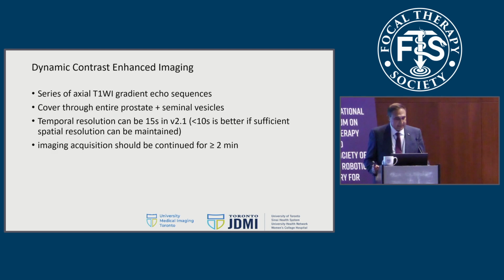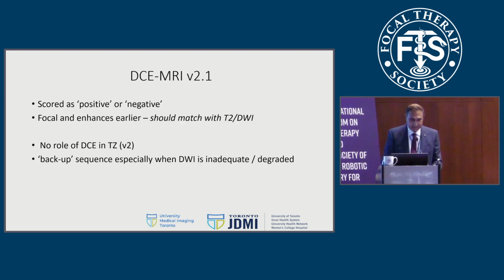DCE is a series of axial T1 gradient echo sequences. Be sure that you're covering the entire prostate and the seminal vesicles. The temporal resolution ideally should be less than 10 seconds. And what do I mean by that? That every 10 seconds, you should be scanning the prostate. And I'm going to show you an example in the very next slide. The imaging acquisition should be continued for about 2 minutes. And it is scored as either positive or negative. It's kind of binary in our PI-RADS version 2.1.